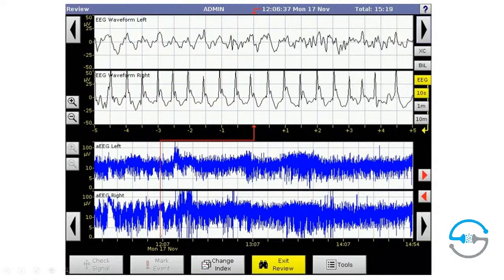And then, of course, opening up one of these uprisings and validating whether or not we see a spike and a wave and a rhythmic behavior of the EEG, and lasting for more than 10 seconds. But the intermittent uprisings here are the things that really clue us into there being an issue with the brain, not necessarily with the background activity. The background looks pretty good, but there's definitely these uprisings which give us a clue towards the brain dysfunction.